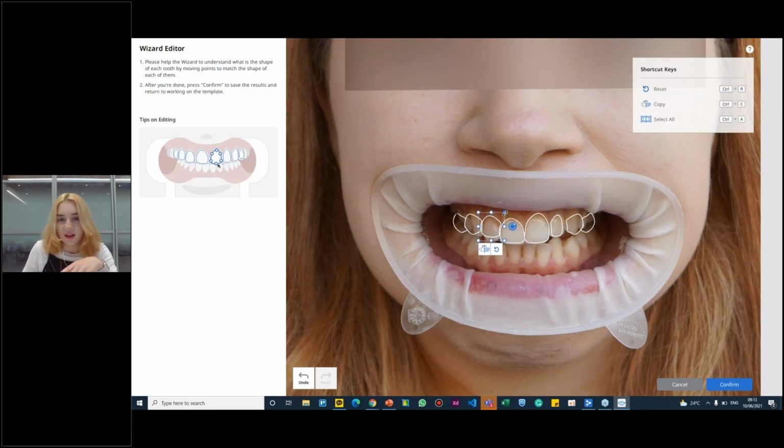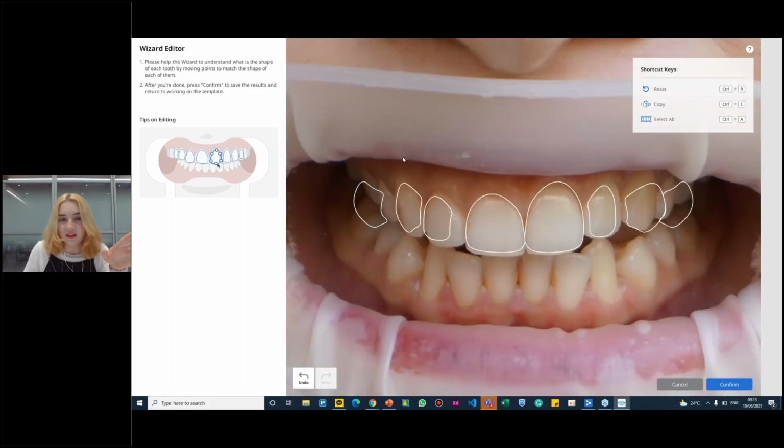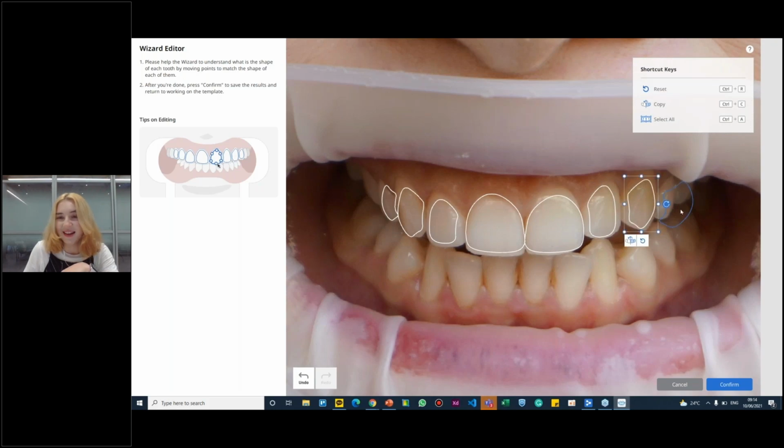the detection results. So basically for this feature, what the program does is that it understands where each tooth is, and then it takes the texture out of it. So Maria, if I understand correctly, you're selecting the area of the tooth that you want to pull the texture from, and the color. Is it the shade and the color and the texture? Yeah, exactly. This is exactly what we're doing.